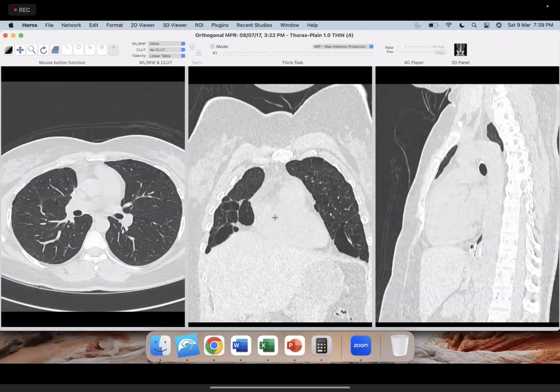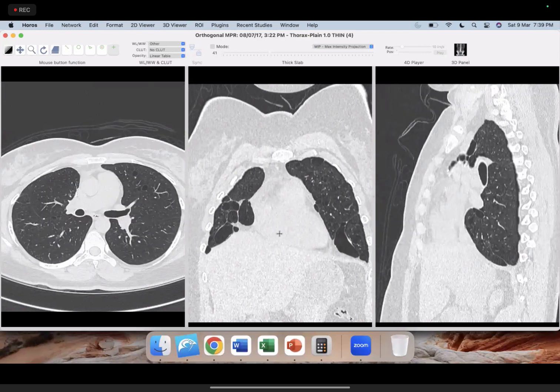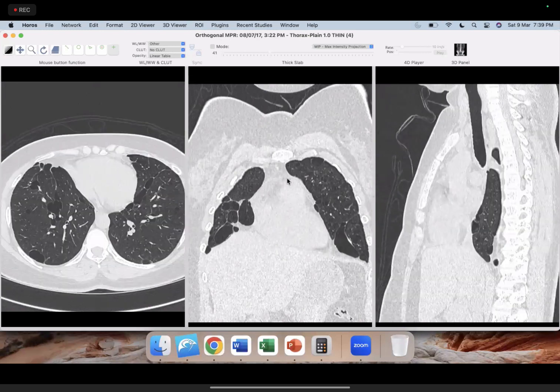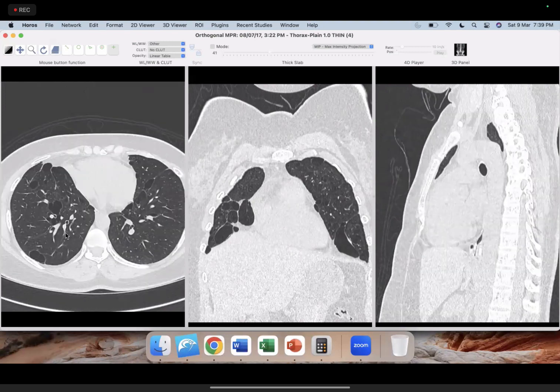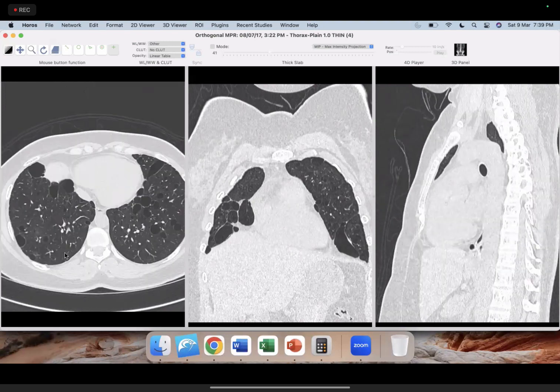This patient is a 42-year-old female. So then it fits for a diagnosis of... So far, still okay. I have a couple of correct diagnoses, but incorrect also. LCH also, somebody saying yes, LAM, lymphangioleiomyomatosis. So this is how you can make this diagnosis in a typical clinical scenario with this typical appearance. And remember, the intervening lung is normal.